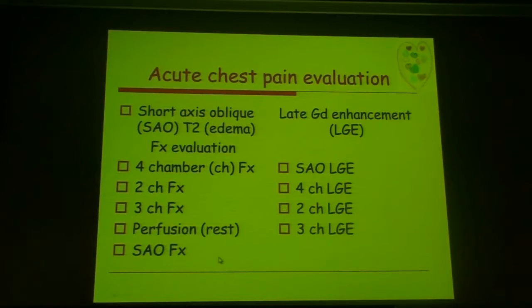We're doing that after the administration of gadolinium because we're trying to shorten our scan time. The whole scan is going to take between 40 minutes and an hour, which is relatively long, so we're trying to use the time from the administration of the gadolinium until we acquire the delayed enhancement images, which, as we've seen previously, is 10 minutes, and do something within that time. This is why we're acquiring some of our function images throughout that time.